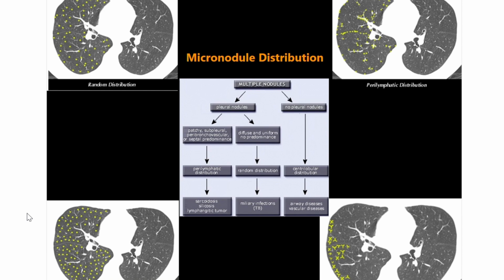And these 2 slides reference the fact that the centrilobular distribution can be round ground glass nodules or V and Y-shaped opacities. And you can see here the differences between the differentials of, once you decide what pattern it is, the things it could be.